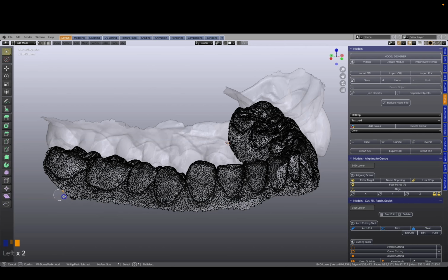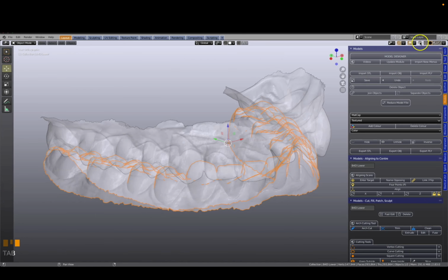Again, highlight the vertices which you want to delete. Since the circle selection mode is still active in the toolbar menu, in order to deselect the tool, you'll need to go back to the menu and set the tool back to the tweak mode. Then press X on your keyboard, followed by the delete option. Press Tab to exit the edit mode, then also undo the transparent mode.